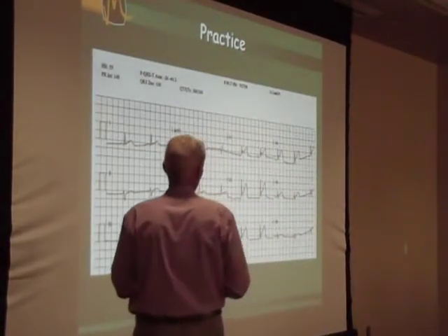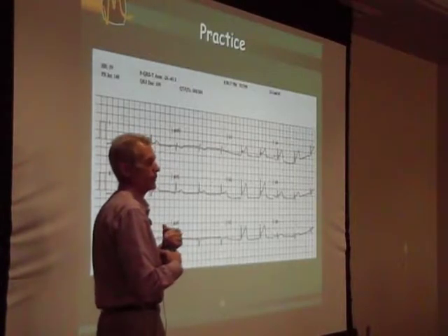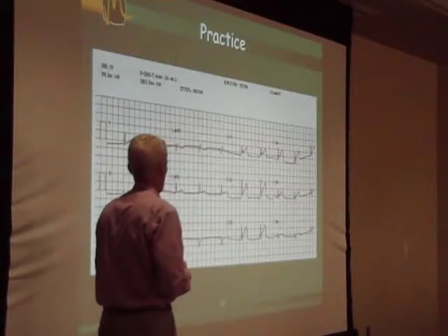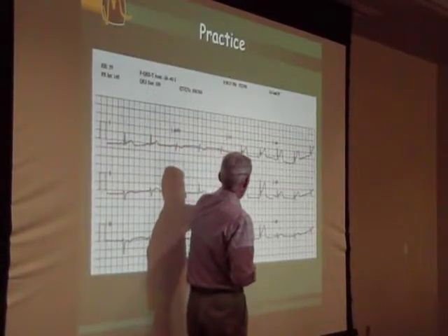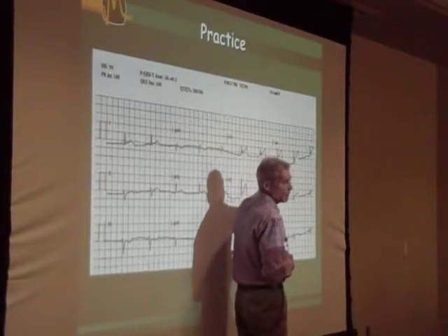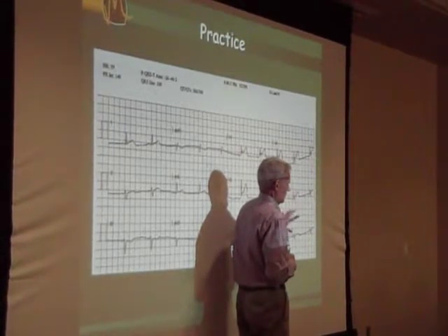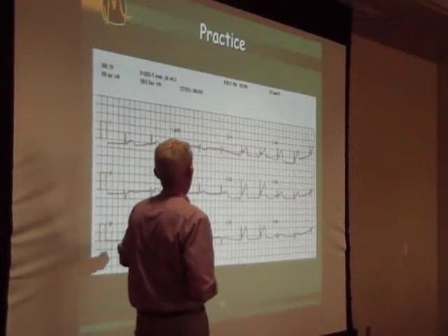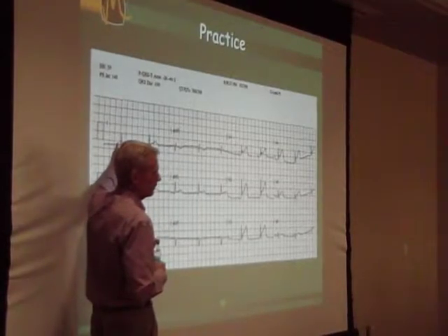Is there an indicative pattern for infarct here? Where at? I think you would all agree V1, V2, V3, V4. Do we have it in V5? How about V6? It looks suspicious. Anyplace else? Good. Look at AVL and also lead 1.